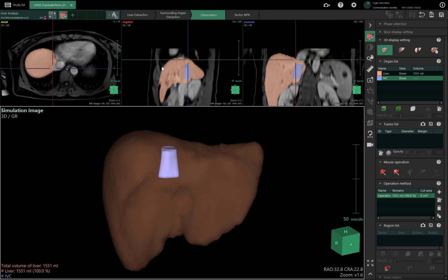That is something up to your interpretation. It's not something really seen or really displayed there. So that's the point: you cannot 100% trust this. It's more an orientation of how to approach the surgery, what's the better approach, but we will lack much real information that we would have with a CT with thin slices. It is the way it is. Something else? Sorry, I cannot be more precise than that.